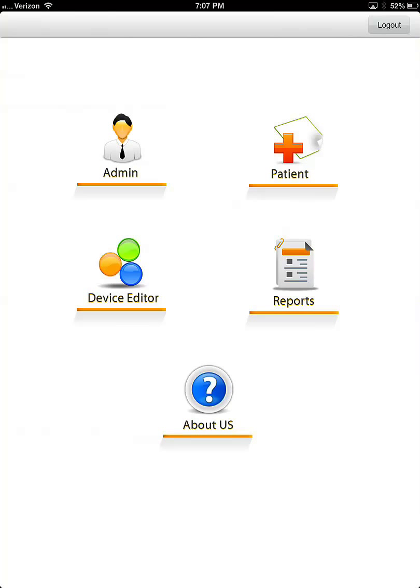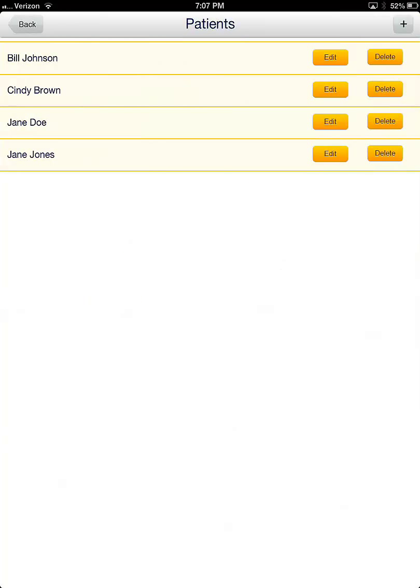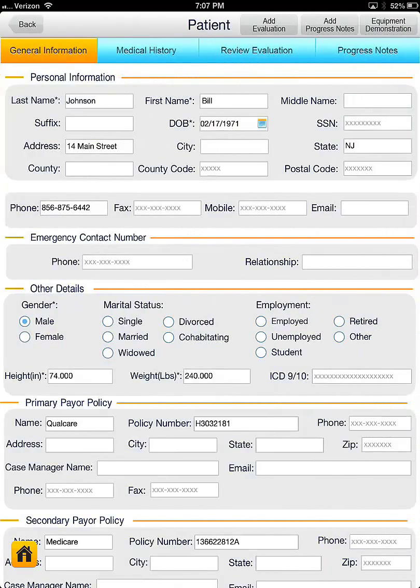Logging in. Now I will demonstrate how easy it is to use Mobility Expert. For demonstration purposes, I will use a saved assessment. Depending on your version of iPad, you may find the dictation feature very helpful. I will demonstrate. To begin, I'm going to select this patient.